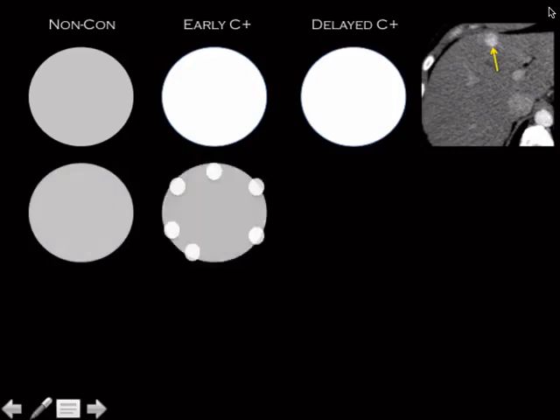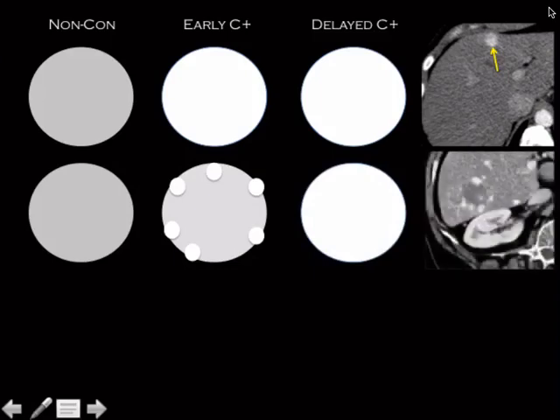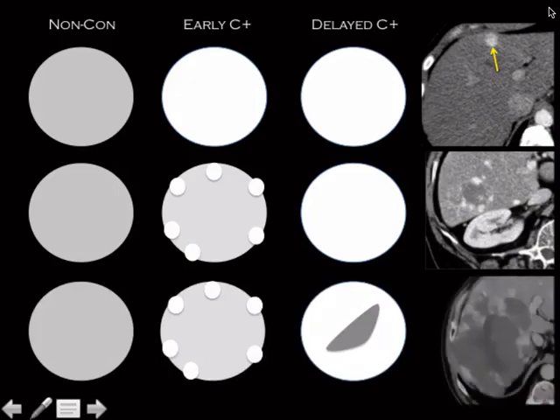Then you've got the more classic look, where you've got peripheral nodular discontinuous enhancement that progressively fills in, follows blood pool. That's this one. That's the one everybody's familiar with. And then you've got these big, scary-looking guys that can be massive, and they often have a central-looking scar to them. It's nice if you get a 10-minute delay on this. If you had a next step question, it'd be: I want a 10-minute delay. The tech is called from the scanner and has already told the patient they have cancer.